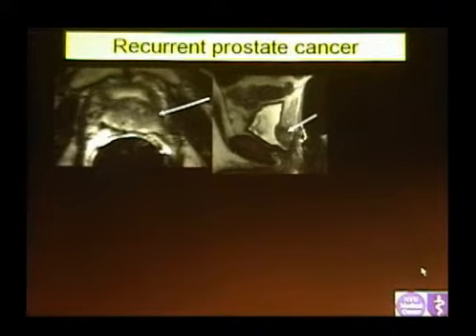It was pretty small for a prostate, so I thought he had some kind of TURP, but the patient turned out to have had a robotic-assisted prostatectomy. We started doing that a year ago in our department, where we use these robotic instruments where you can palpate in 3 dimensions, basically.